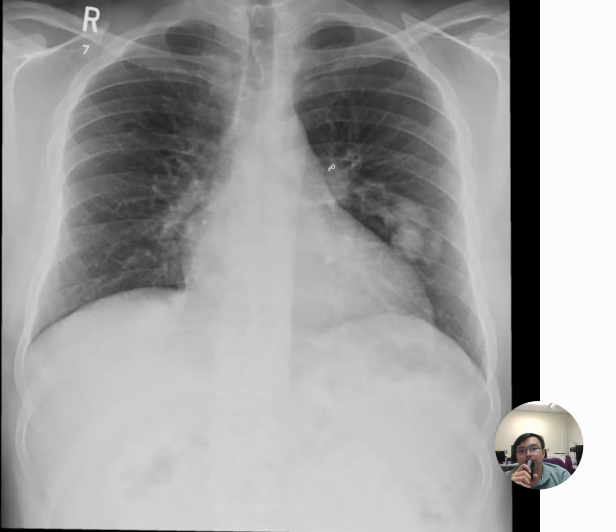So in order to confirm the diagnosis, you need to do a CT, including the arterial phase, and the scan should also cover the entire liver in order to demonstrate possible associated AVM or even some angiomatosis. If this kind of patient starts to have some neurological symptoms, you need to consider two possibilities.